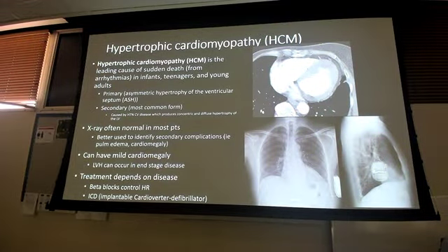Right? So ideally, and this is a perfect example, they should all be flipped the other way, but it doesn't really matter. It's still a left lateral. That's why I wanted to make that clear, because it just depends on how they send it over, but either way, it's a left lateral. And again, don't get so hung up on it.